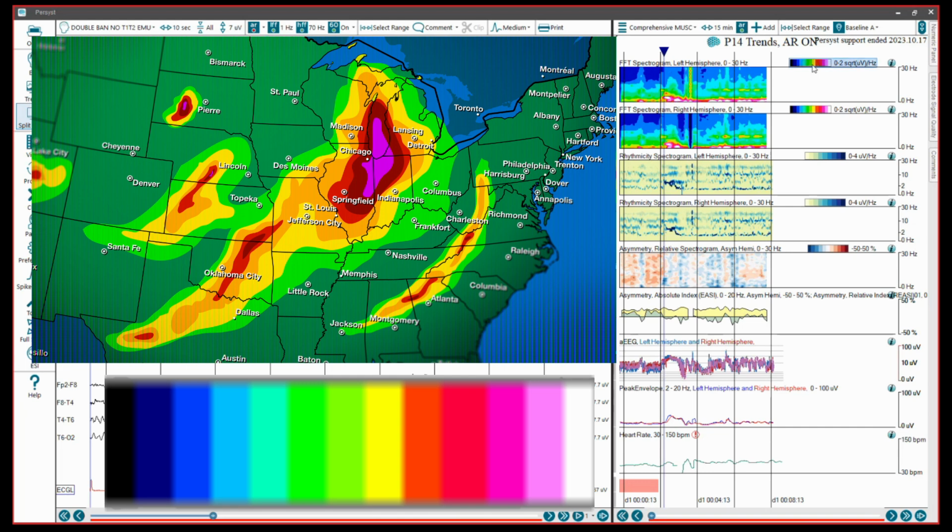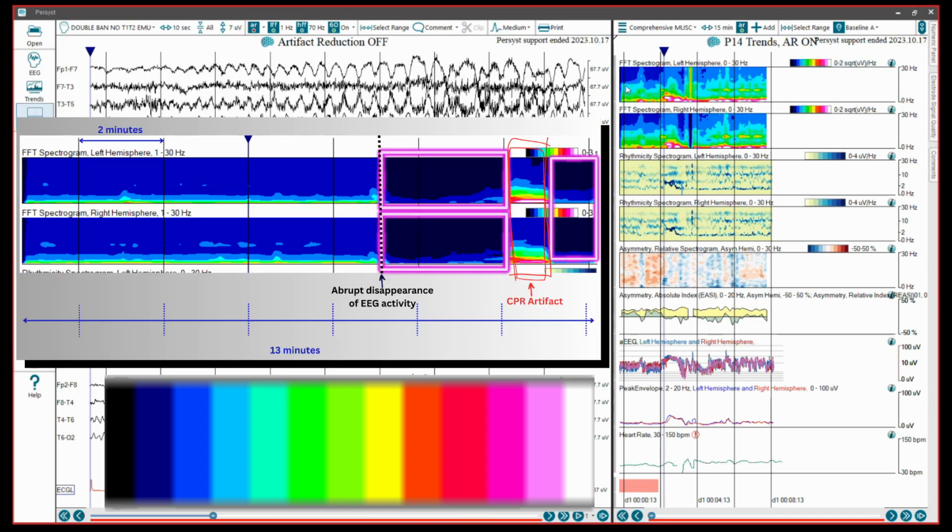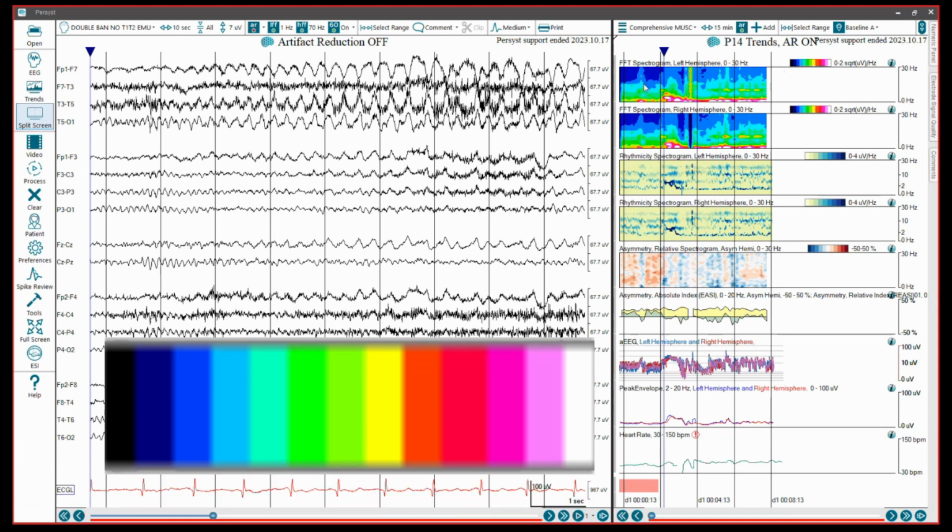So if you had a patient that you were recording who was unfortunately electrocerebrally silent, then you would just see black across all of the frequencies across time. There's a little bit of activity at this dark blue, and then a little bit more with teal, kind of lime green. That's like moderate activity.